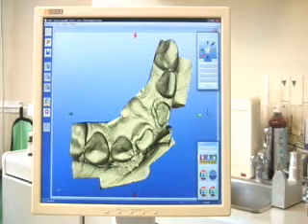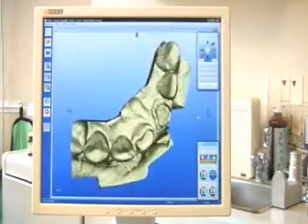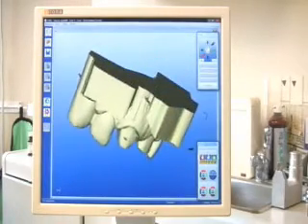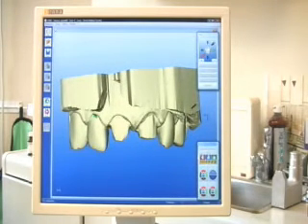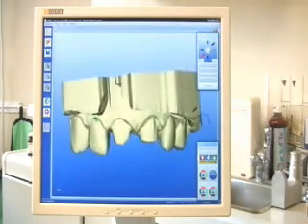We have plenty of information on the adjacent teeth to help with the orienting of the anterior overlay in a consistent manner. With the tools available to us in our CAD/CAM software, we will be able to manipulate the virtual model by, in the case of the CEREC, depressing the left mouse button and rotating the trackball. We can change its pitch and yaw. Then by depressing the right trackball button and manipulating the trackball, we can move the virtual model in its entirety.